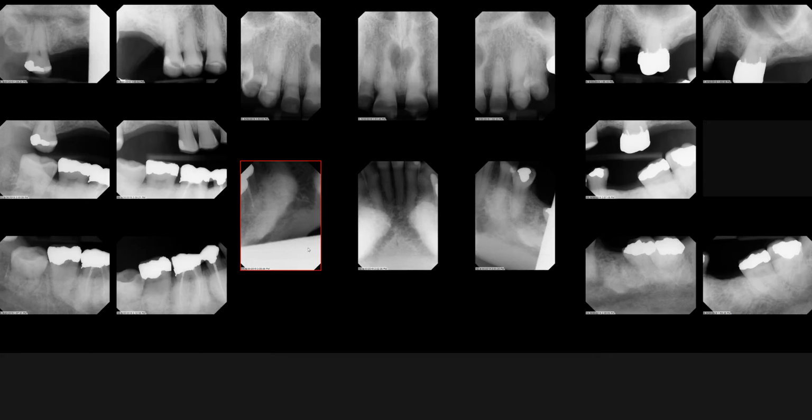involved dentition. I do want to make a quick note that this opacity is different from this opacity that we see at the bottom of the radiograph. So this is an example of a cone cut image. And let's continue to look posteriorly.